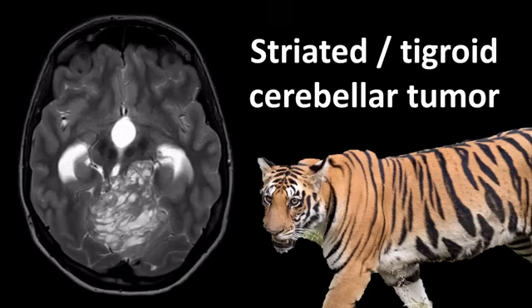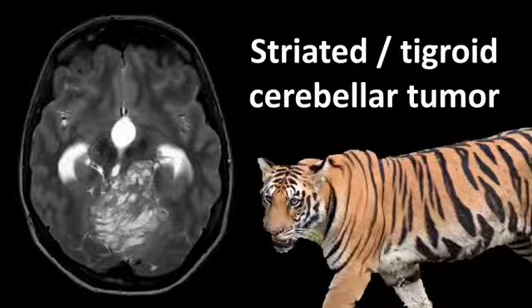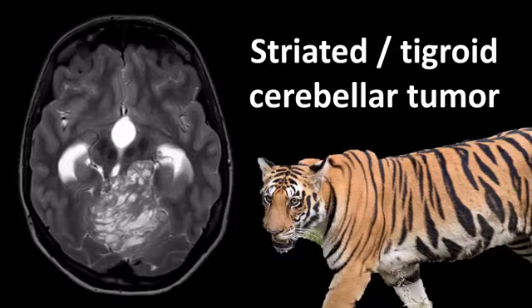And this is a case where these radiological signs can be very handy, because when it comes to rare pathology, we don't encounter these kinds of tumors enough to have a good feeling of their typical imaging appearances, but if they're associated with an Aunt Minnie or a radiological sign, they are very easy to remember. You just have to have seen them once, and the next one will look very similar.